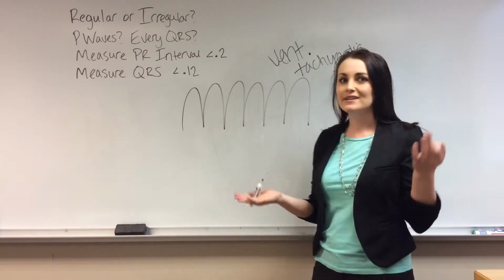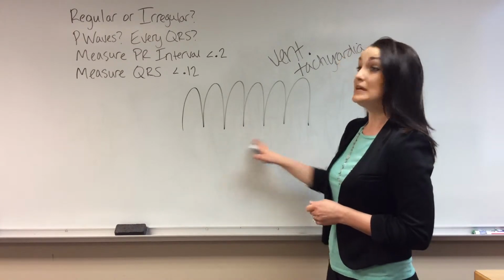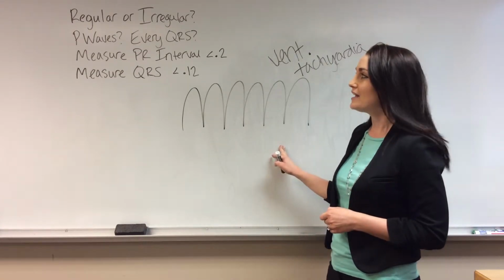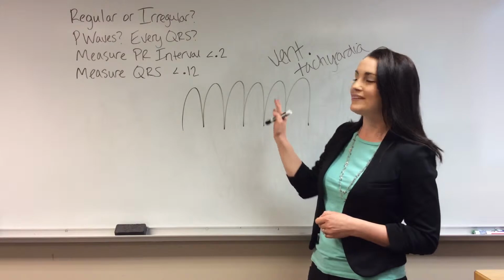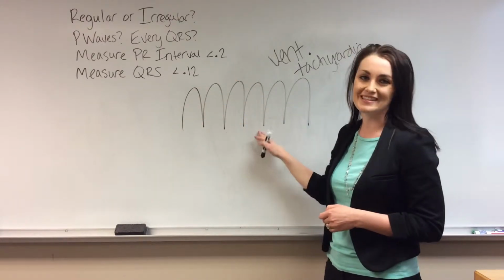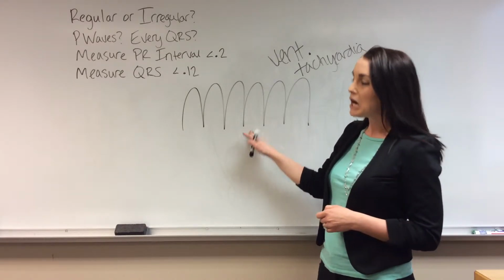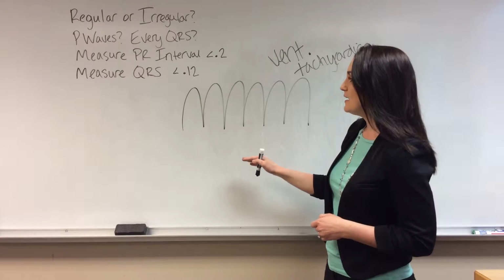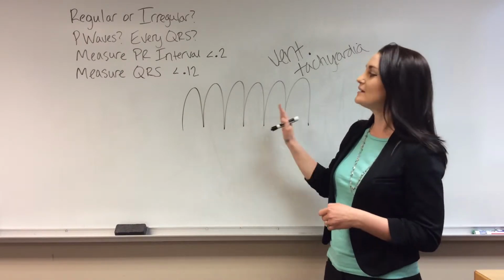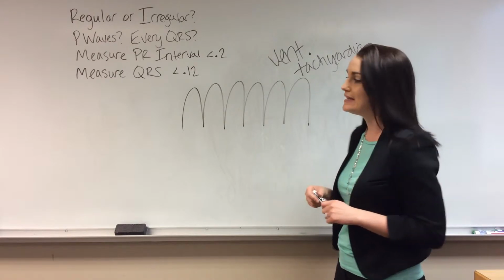It can be irregular, but it's so fast and so unique and bizarre looking on its own that you'll quickly throw your rhythm method to the wayside, because there are no P waves to measure, and no PR really to measure. It's pretty regular, it's fast, and it looks pretty similar to this, wide ventricular beats.